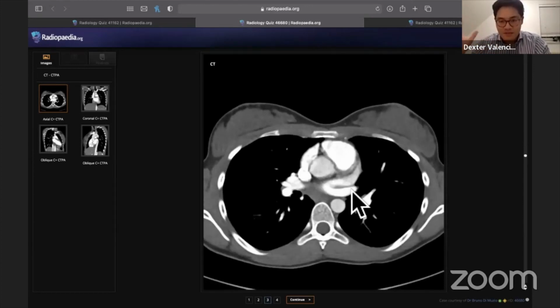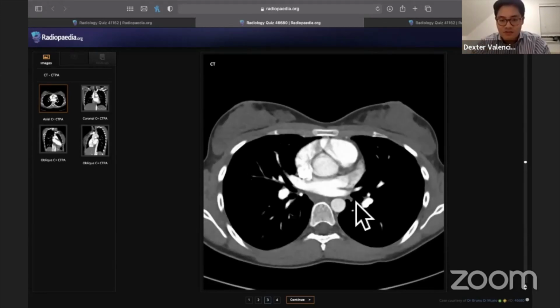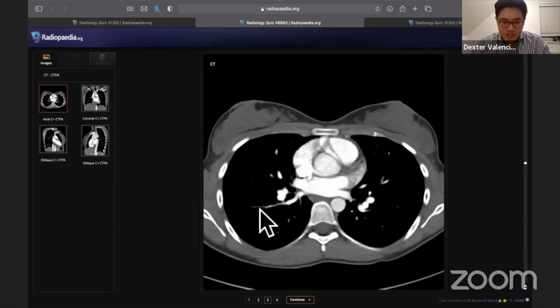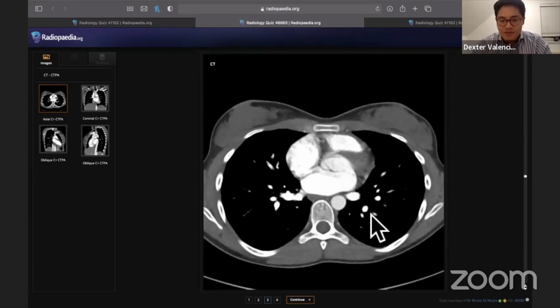Once the blood has been oxygenated, it will then return to the heart through the pulmonary veins. So for example, if we follow this structure here, it will be returning from here, going through this structure and then into this more posterior cardiac chamber, which is the left atrium. And this left atrium will tend to have 4 pulmonary veins draining from the lungs.